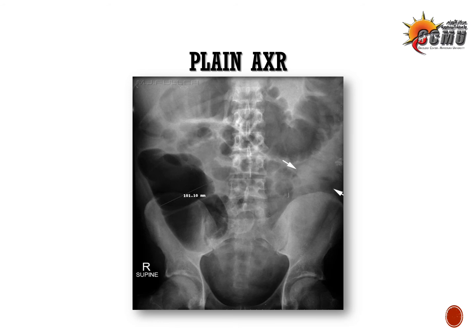Okay, now you should know that large bowel obstruction constitutes a quarter of all cases with intestinal obstruction. In this film, as you can see, there is dilatation of the cecum and ascending colon. The diameter of the dilated part of the bowel extends beyond the normal boundaries, beyond 9 centimeters for the cecum.